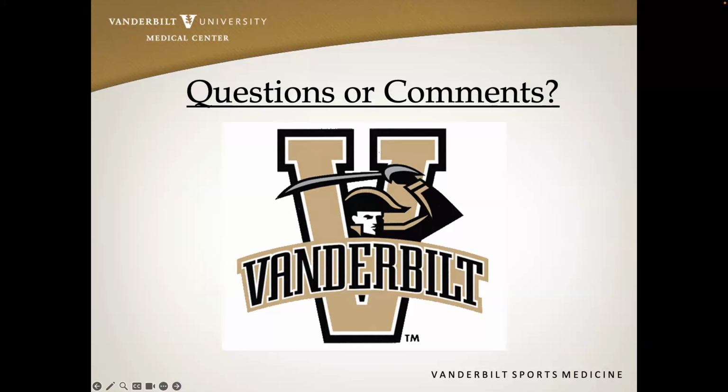But as you had mentioned, one thing to really highlight for this case, if you don't see a lot of pediatric patients, is being aware of those secondary ossification centers within the knee, especially along the patellar tendon, which can be occurring at the inferior pole, as well as at the tibial tuberosity, potentially with Osgood-Schlatter's syndrome as well.